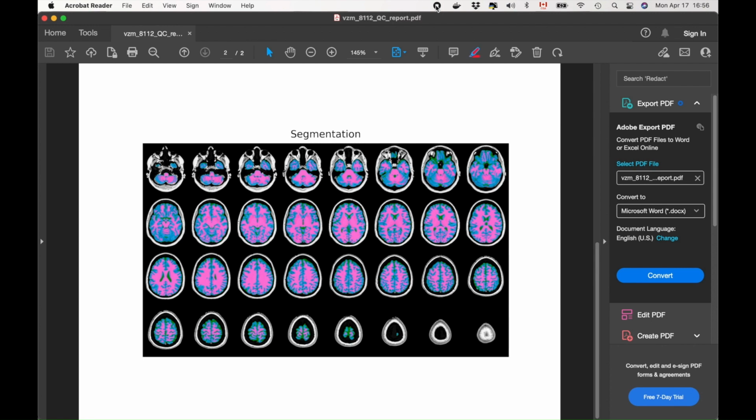Before you visualize images with register, I remind you that you must install the MINC Toolkit. I refer you to our website for the detailed steps. I also stress that these tools are only available for macOS and Linux. If you are working with a Windows computer, you can move to the following timecode where we cover image visualization using ITK-SNAP.